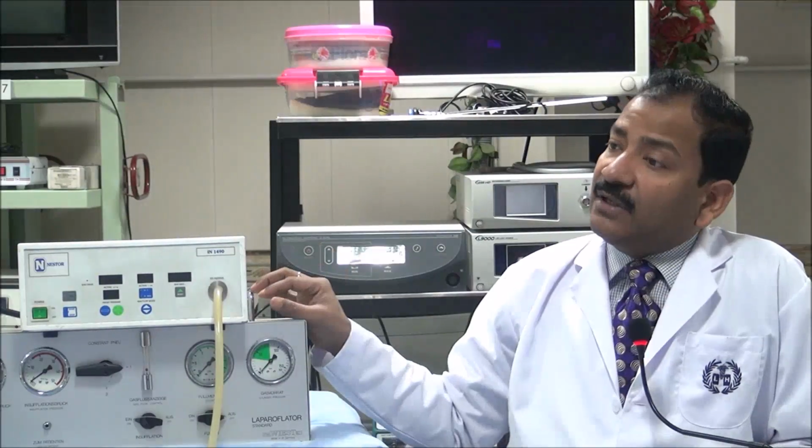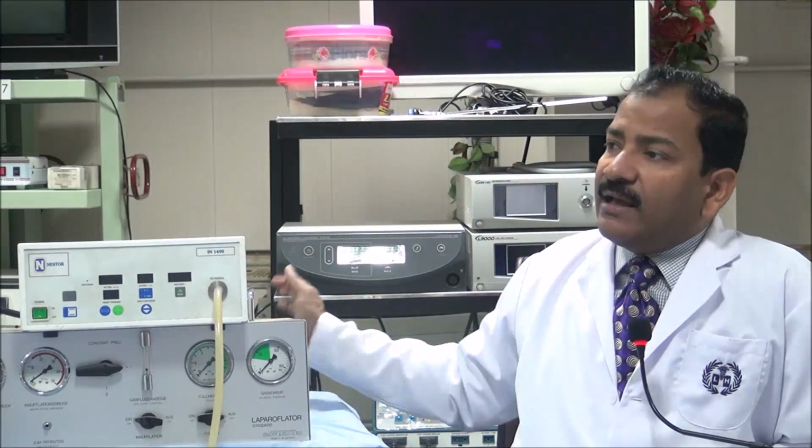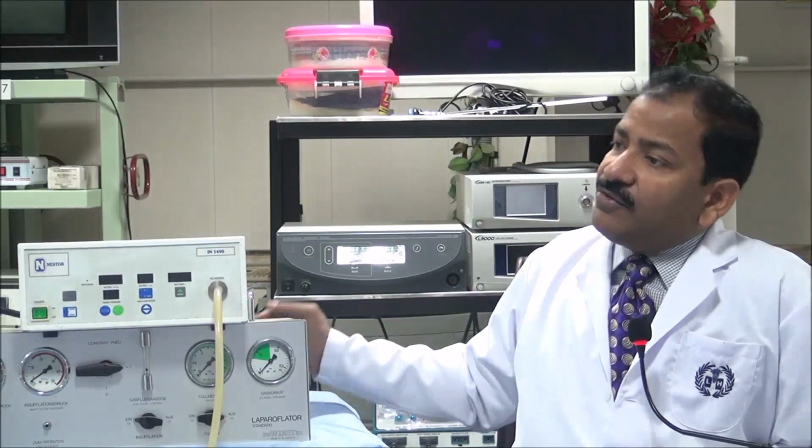And this is also automatic. This also takes care of your flow rate. And if the pressure desired is 12 mm or 15 mm, whatever you set, once the desired pressure is achieved, this also switches off automatically. This also gives you an alarm, but it is analog. There is no microprocessor. It doesn't need electrical connection. There is no bulb, no electrical connection. It works with the pressure of the cylinder itself, and there is a cut-off valve which works on the pressure.